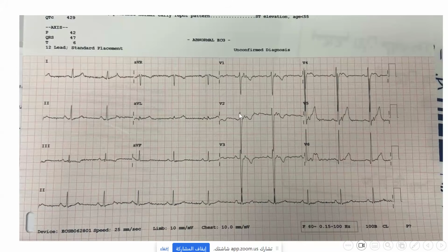But this patient was an anxious patient. I know him very well. He came to me in the clinic presenting with cardiomyopathy, and they put an ICD for him. He received shocks from the ICD and was ablated twice. I did this 12 lead ECG, and we found this abnormal pathology, which is very characteristic. We couldn't do an MRI to diagnose the ARVC, but we diagnosed it from this ECG finding.